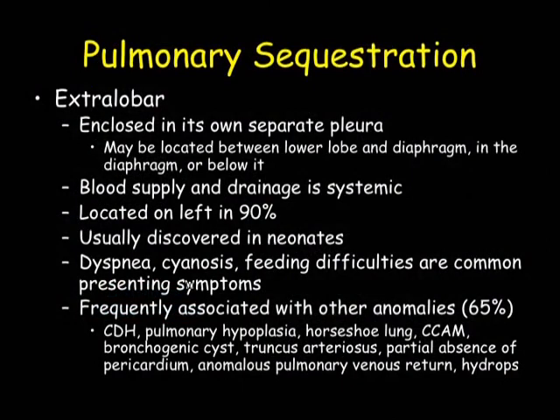Now, we do see extralobar sequestrations frequently. These have their own pleura. They are usually on the left. They can be above, in, or below the diaphragm.